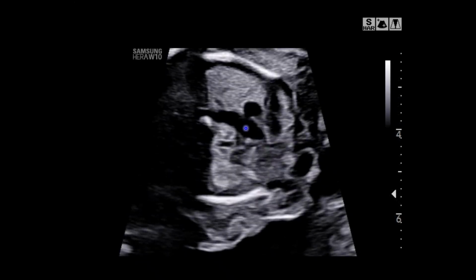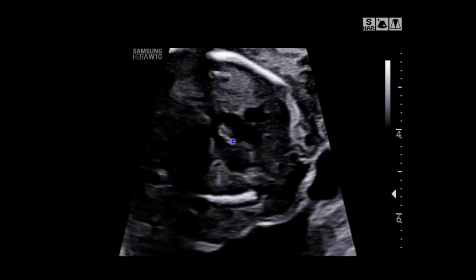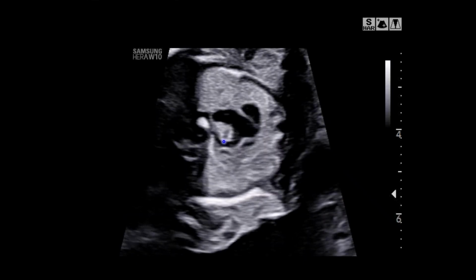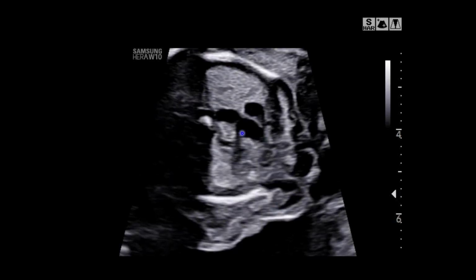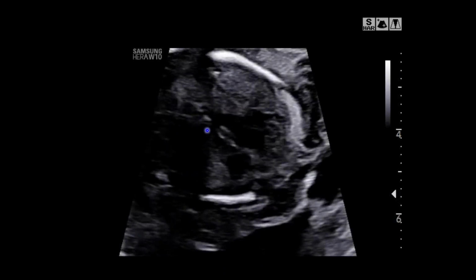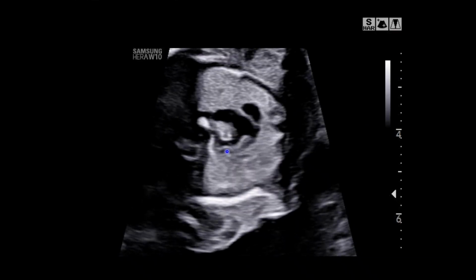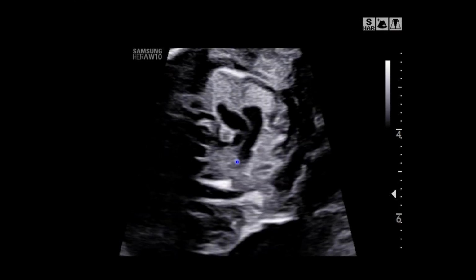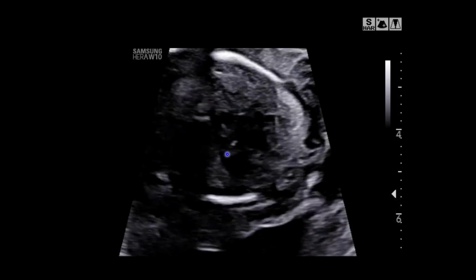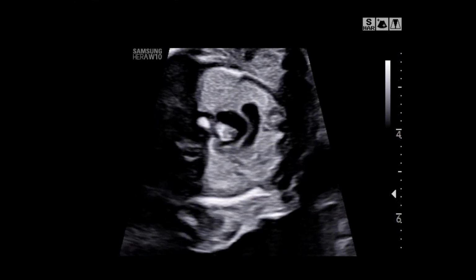But the reason why we're this high is you can see that smaller vessel that transitions in front of the trachea here and then starts to curve backward. And this is actually a hypoplastic left-sided aortic arch in this double aortic arch subtype of vascular ring. And at the very end of that, you start to see the MPA here, right here, and then the ductal arch on that side. It is, again, a left-sided ductal arch in this case.